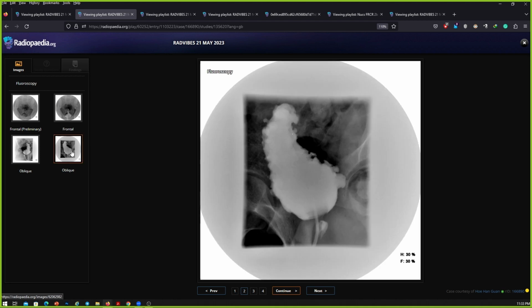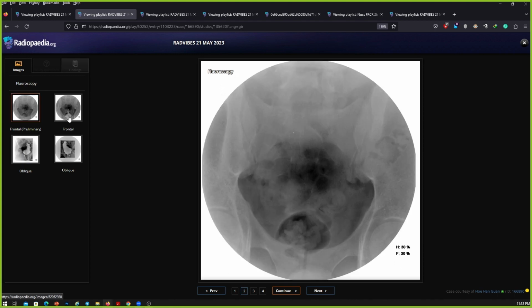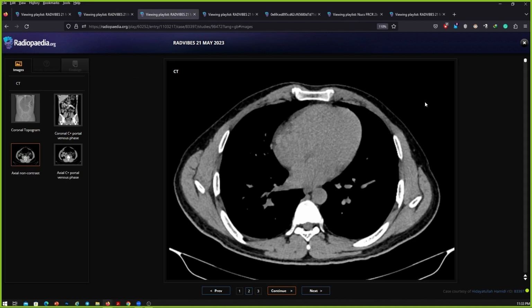And I can also see, I'd like to look for the posterior urethral region. Okay, we'll just stop there. So you're good, and we'll go to the next case now. Here's the next case. Patient presented to us with severe abdominal pain. Okay.